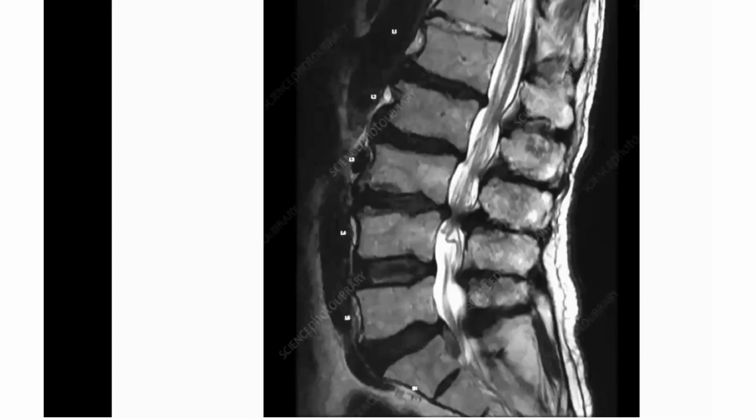Okay. Now look at this. There's a stenosis over here. Stenosis over here. And if you look at this disc, is it this which is compressing the nerve? No. The disc is very small. The main pathology is coming from the posterior ligamentum flavum. There's a flavum which is compressing the nerve roots. So if you have such compression, don't go for the discectomy. There's no point in going for discectomy in this case. You have to target the flavum. You have to remove the flavum from here.